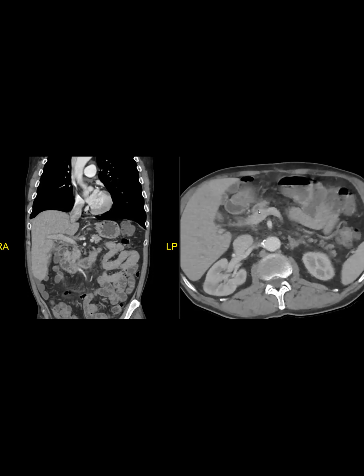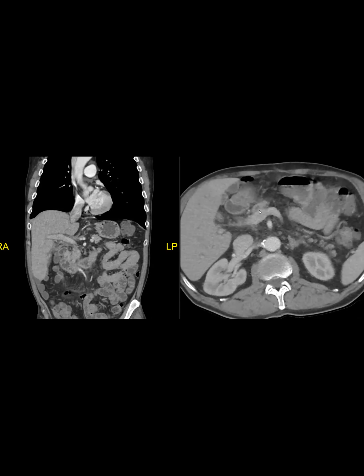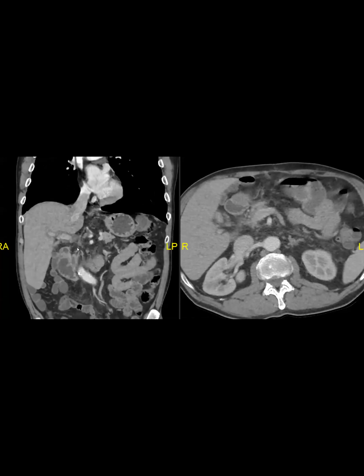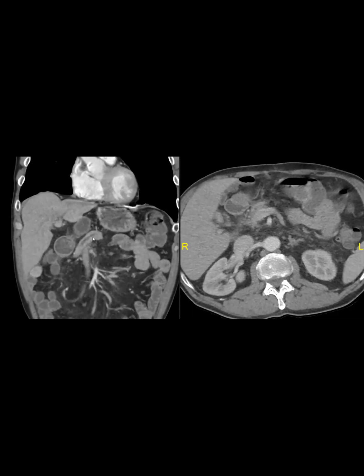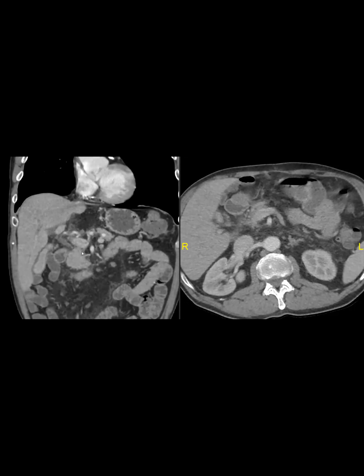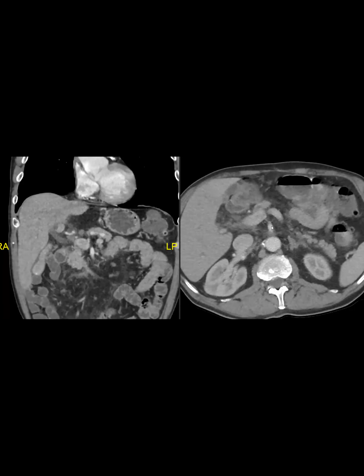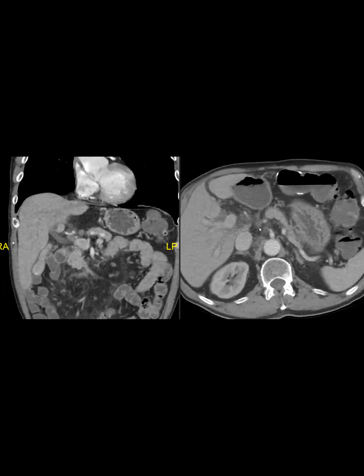This is the head, and then all of a sudden the duct becomes focally dilated and just gone, right? And then when you look in the coronal, the same thing. It's not really dilated, you can actually see it, and then it stops and you don't see anything. Maybe there's a lesion, it's unclear. But if you look carefully, there's a lymph node right there, and then there's a little fat infiltration right there. You can see it.